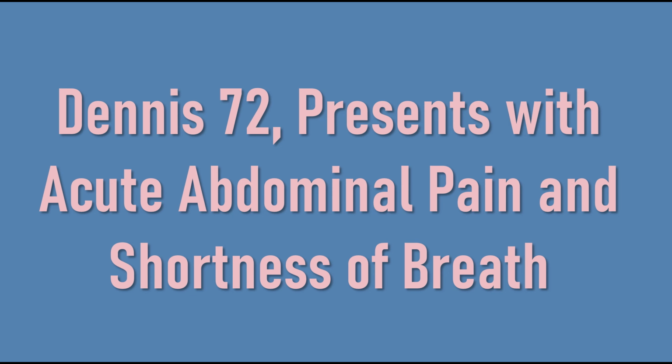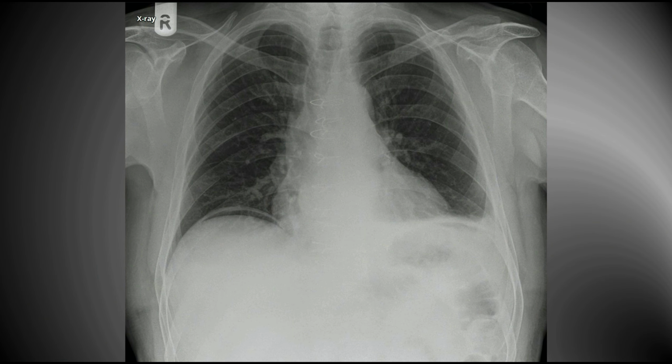Dennis is 72 and he presents with acute abdominal pain and shortness of breath. Do you see any abnormalities on this chest X-ray? The abnormality is here, and this is known as pneumoperitoneum. Pneumoperitoneum is the presence of air in the peritoneal cavity.